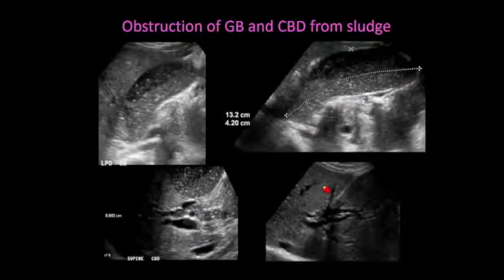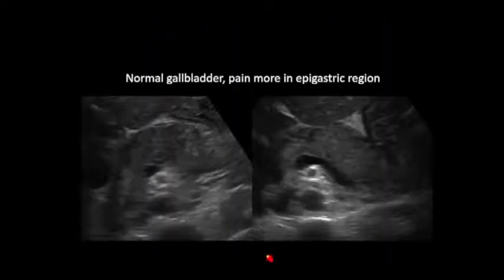This is a case, as I mentioned earlier, in which sludge, tumefactive thick sludge, can cause problems. And this is clearly, sort of obvious, a big tensile gallbladder filled with all kinds of debris. And there are dilated ducts in the liver, and the debris is in the duct, the same thing. This toothpastey stuff is going out and causing trouble everywhere.